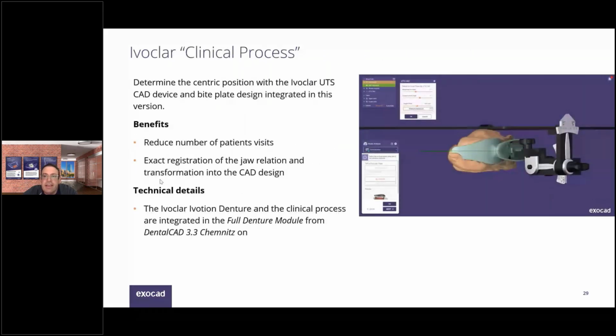We've integrated the Ivoclar clinical process, so the Ivoclar UTS CAD device. This is integrated in the generic version of the software, so there's a workflow for using this, if you have users that are using that Ivoclar process for dentures.